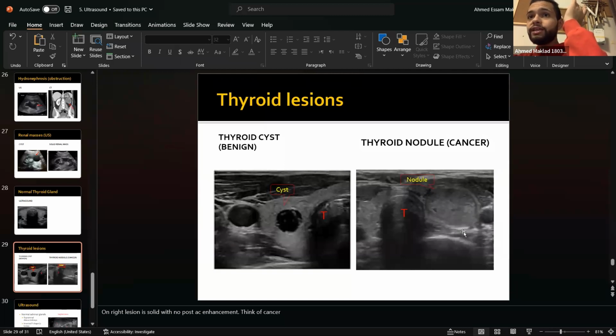And if you didn't see that there's something like a capsule or a differentiating line between the normal structure and the cancer, you would think that this is normal. But because you can see that this is obviously a mass, right? This is obviously something that does not belong to this area, you should start suspecting that this is cancer. But because there's no enhancement and no shadow, you can rule out an abscess or a cyst, and you can also rule out stones.